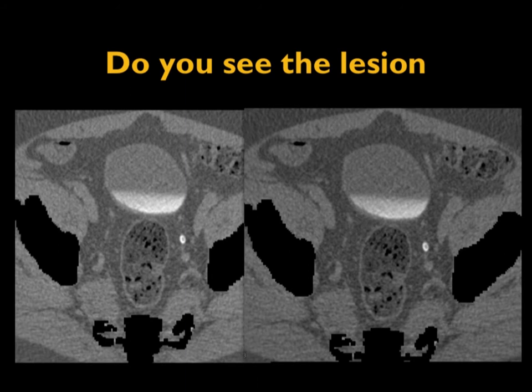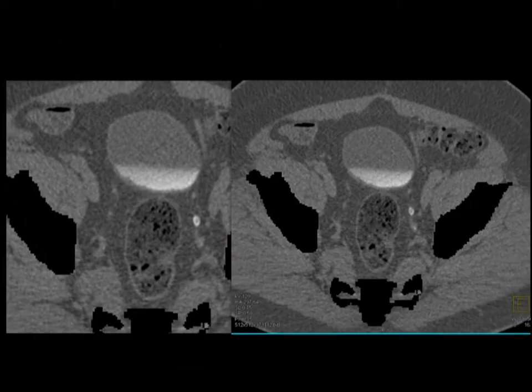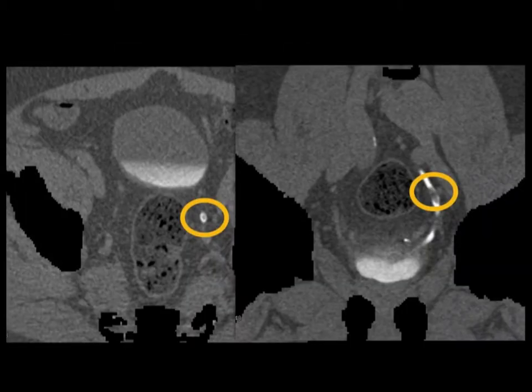Look at the left ureter. I widen the window and you sort of see a donut appearance, but it's very, very subtle. And then when I go along the track of that ureter, now you see an under 1 centimeter transitional cell carcinoma of the left ureter. It's a small but obvious tumor. When I put a circle around it, it's very obvious. But look at the fact there's no obstruction.